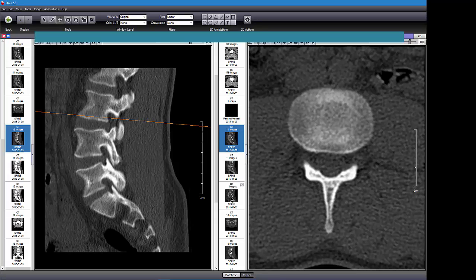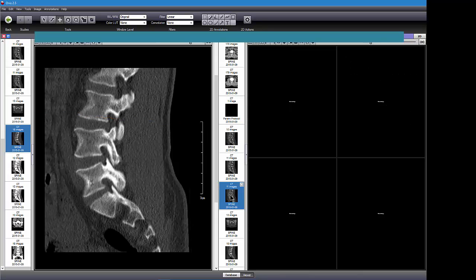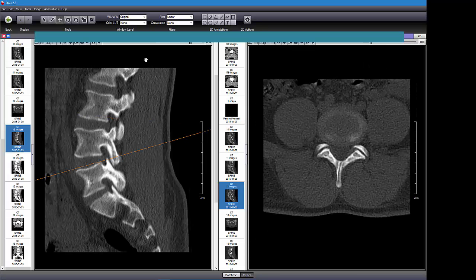So I see what they did. They have a whole bunch of little ones. Let's try to go down to this image. Don't want to spend too much time. I don't want to make this too big.